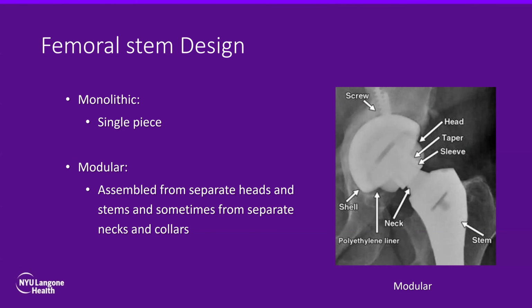So there is no one single implant that can fit every single patient. Before the surgery, the surgeon makes some measurements of the patient, and they decide on the length of this one component, on the angle of the component. Because of that, most of the hip arthroplasties nowadays are modular.